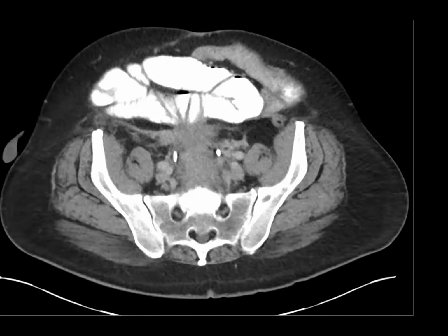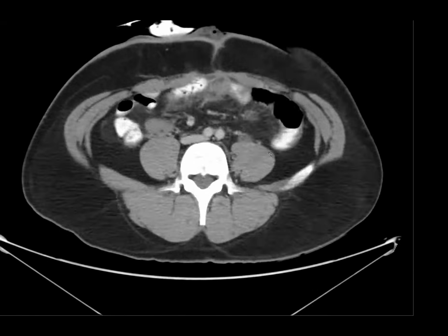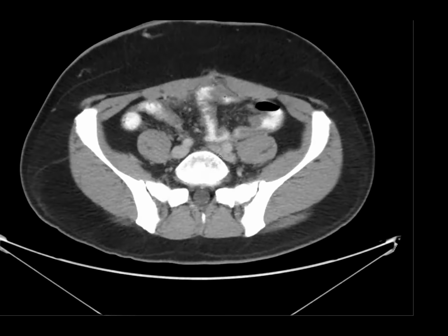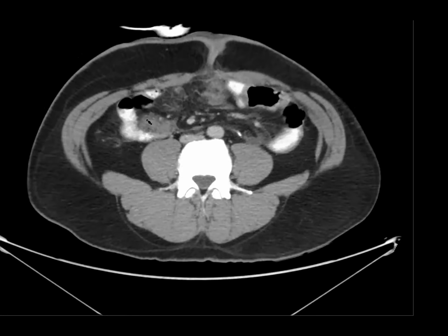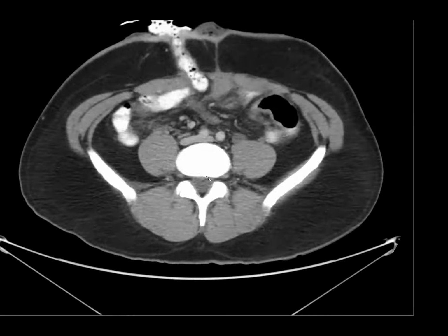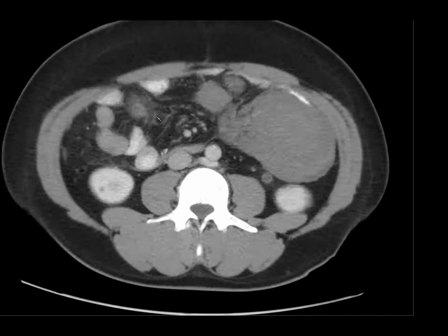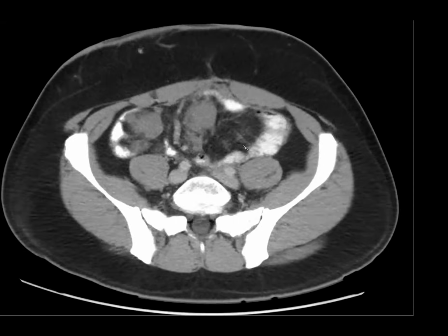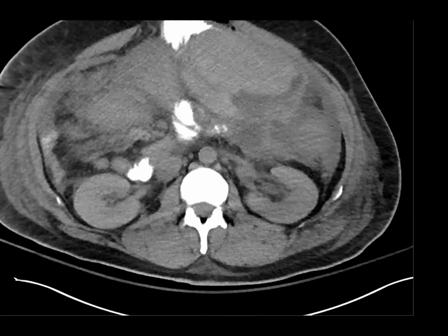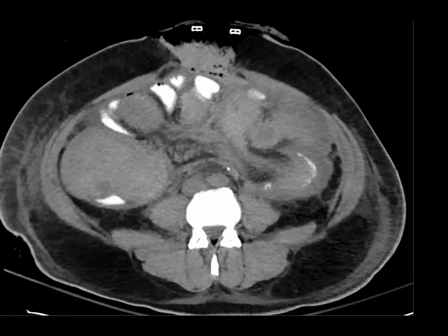And then I have one more case of it. So this case, the patient also has FAP type Gardner syndrome, and they had these soft tissue masses. They were more rounded, less infiltrative than the other two cases I showed you, but multiple of them in the mesentery. And then this was 6 months later. So you can see that they markedly are growing really rapidly. And they were put on a number of medications. And then this was 6 months after that. So this was a very aggressive type of desmoid fibromatosis in Gardner syndrome.